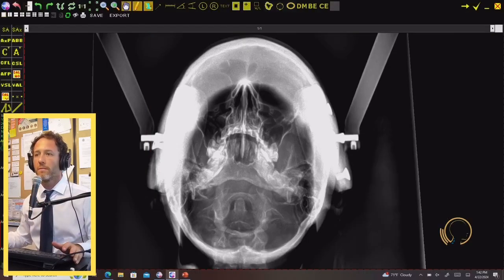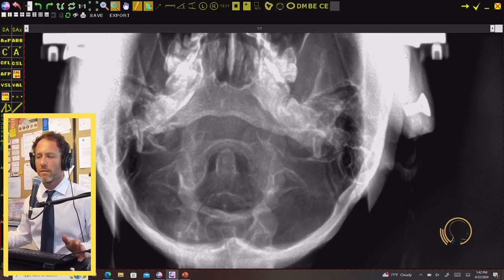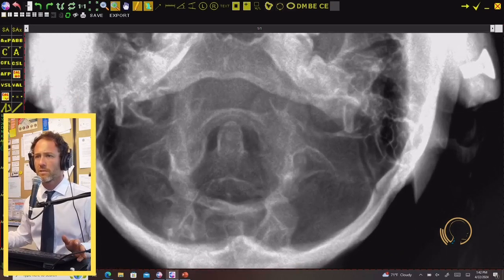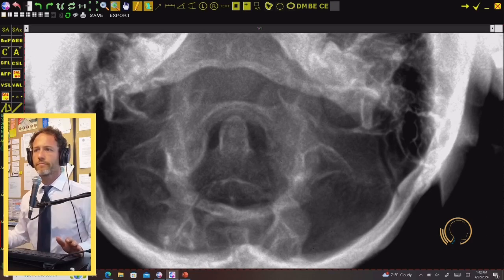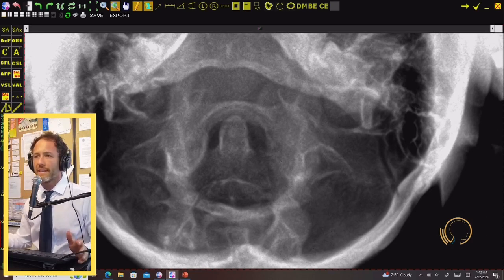So when I go to my film, so you can see what I'm talking about, normally I do the horizontal cephalic line first, but just because we're in it, when we're looking at this atlas, where are the superior and inferior facets? Well, I'll kind of draw here, but you'll notice those inferior facets will be typically a little rounder and then fuller medially.